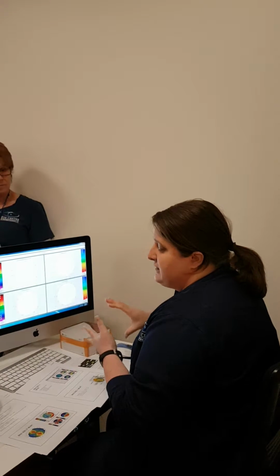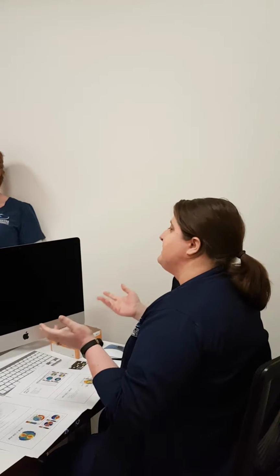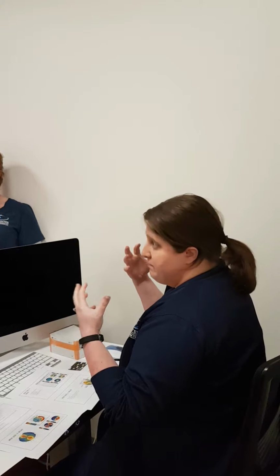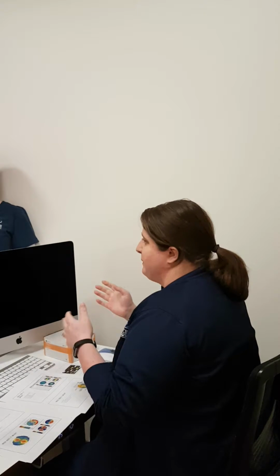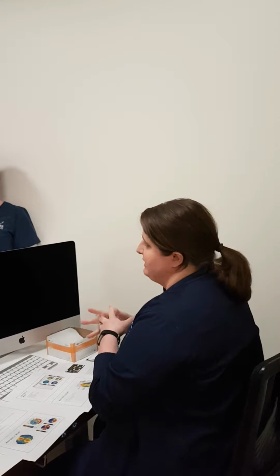Pterygia scars and Salzmann's nodules, these are all things that affect the shape of the cornea because they're growths on the cornea, pushing on the cornea in weird areas, so it's again inducing irregular astigmatism. This lets us see, okay, is it significant to the patient? Is it affecting the central part of their vision? If it's not, probably not really going to bother the patient unless, you know, pterygium can irritate the eye and just make it uncomfortable. But besides that, we don't have to do anything unless it's bothering the patient in those cases.